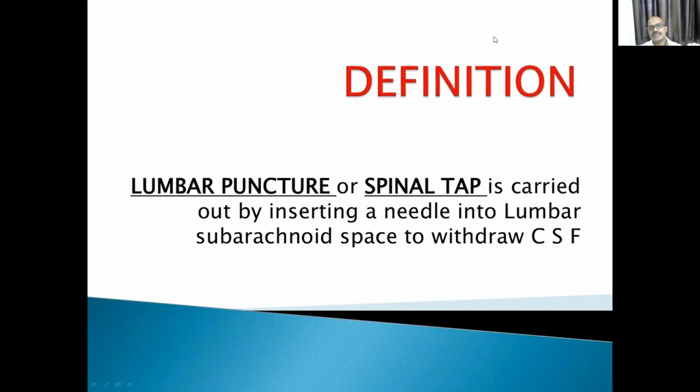Not only that, in the afternoon session during the Viva, one examiner will be sitting with all the instruments. He may ask you to pick up one instrument and tell whatever you know about that particular instrument, or he may give you one instrument and ask questions regarding it. So today's topic is on two needles.